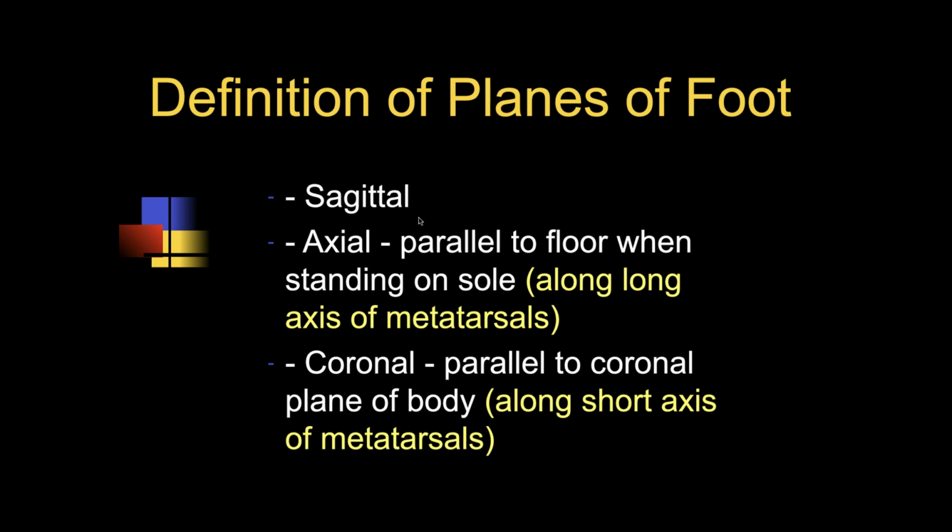But many radiologists and a lot of techs will confuse the axial and coronal planes in the foot because they think of the axial plane as a short axis along the bones, but that's really incorrect, and it leads to a lot of problems. When you get into your practice, you have to make sure that the terminology is used appropriately.